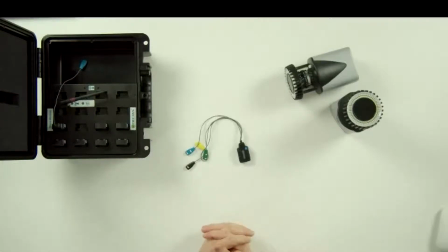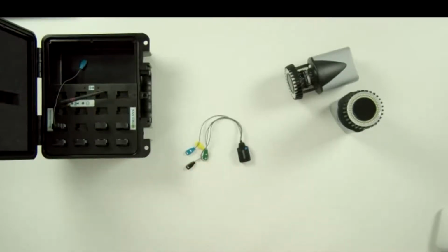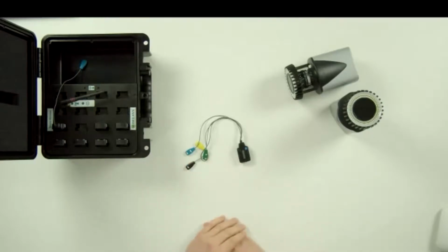And again, we understand and appreciate that most users might not be interested in this, but it does demonstrate the capabilities of what motion capture technology can do, and these multi-channel advanced EMG sensors at the same time. Yeah, so I think that was all I was going to possibly say here, Niels.